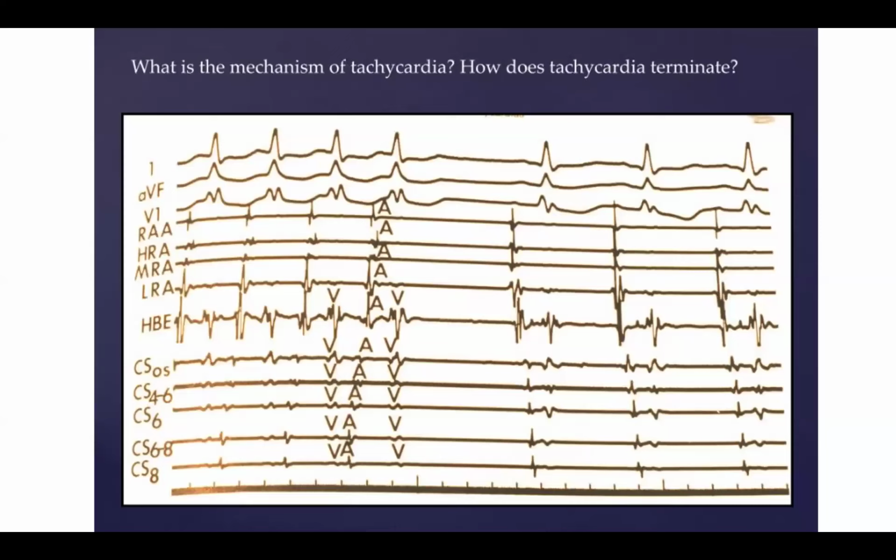All righty. This is the last question of the day. What is the mechanism of the tachycardia, and how does the tachycardia terminate?